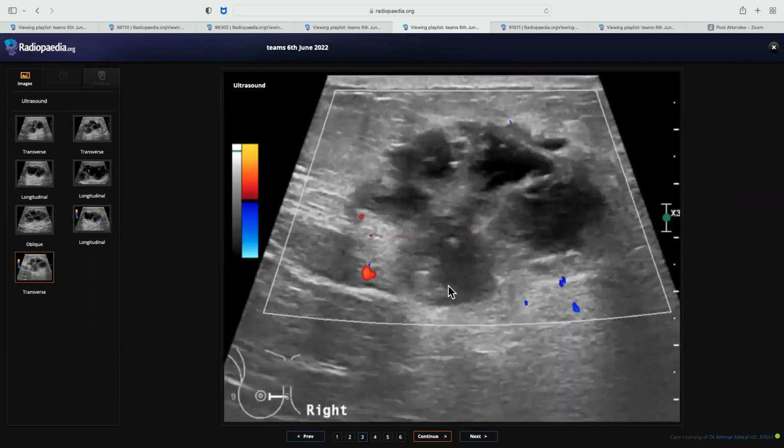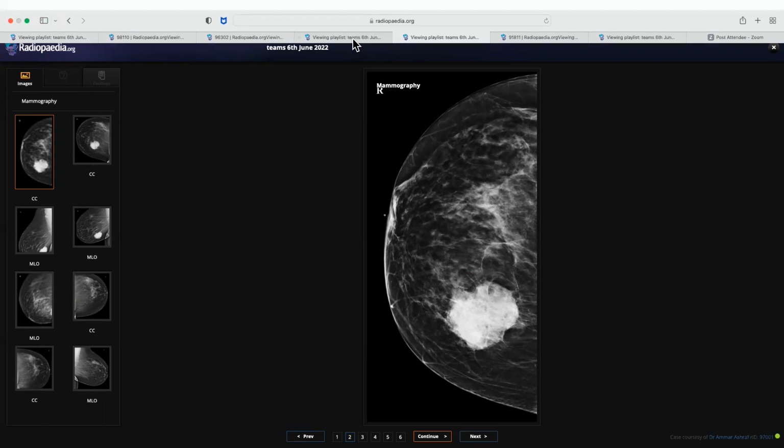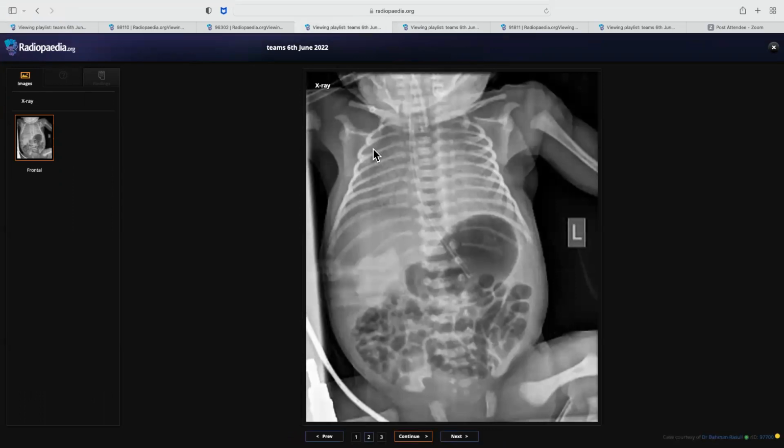This was a case of squamous cell carcinoma of the breast. Squamous cell carcinoma, though, is less common. But that's why I showed this case, because on the mammogram, sometimes when there's a large mass, we quickly think that's a benign lesion, because we are not focusing on the margins when it's a large mass. When it's a small spiculated lesion, we quickly think it's a malignant lesion. So the margins are very important. That's why for the rest of the cases you were bang on. You told everything, nothing I can point out.